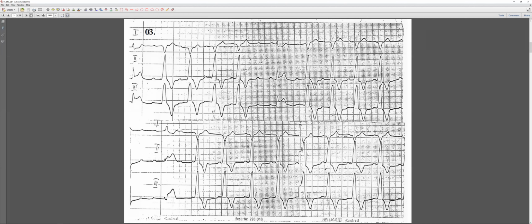You should go for a longer interval. If you look, 1, 2, 3, 4, 5, 6, up to here, 1, 2, 3, 4, 5, 6. Yes, it's 60. All right, go on. And then I can calculate the axis as well.